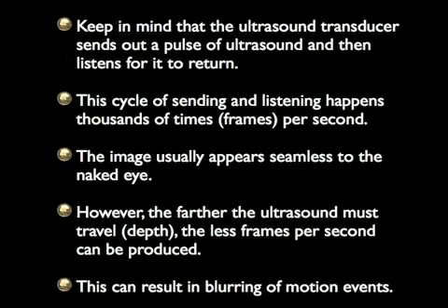It should be noted that the ultrasound transducer sends out a pulse of ultrasound and then has to listen for it to return. This cycle of sending and listening happens thousands and thousands of times, i.e. frames per second. The image usually appears seamless to the naked eye. However, the farther the ultrasound must travel, i.e. the depth, the less frames per second can be generated, and motion-related events can become progressively blurred.